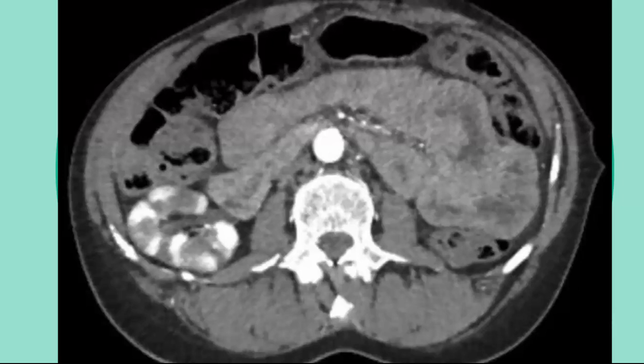Hypoperfusion of the bowel leads to third space losses of fluid into the GI tract. The mucosa becomes more permeable and contrast and fluid leak into other bowel wall layers, which we can see here going all the way across. The small bowel findings are often the most prominent CT findings due to the vulnerability of the intestinal mucosa to ischemia. Trauma is the most common cause, as well as cardiac arrest, CNS injury, septic shock, and diabetic ketoacidosis.